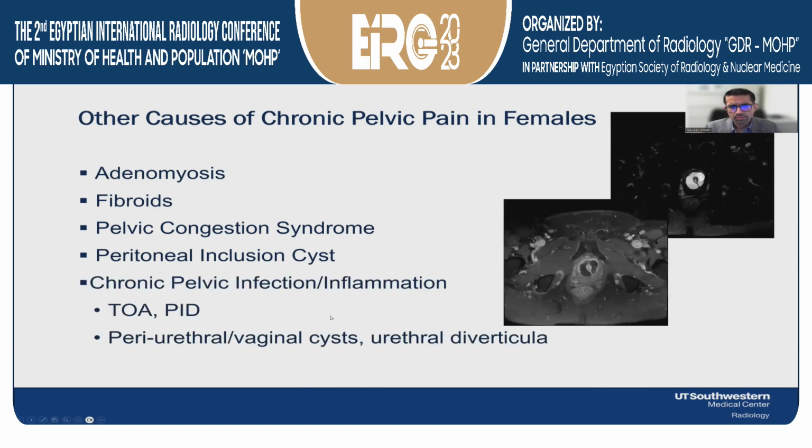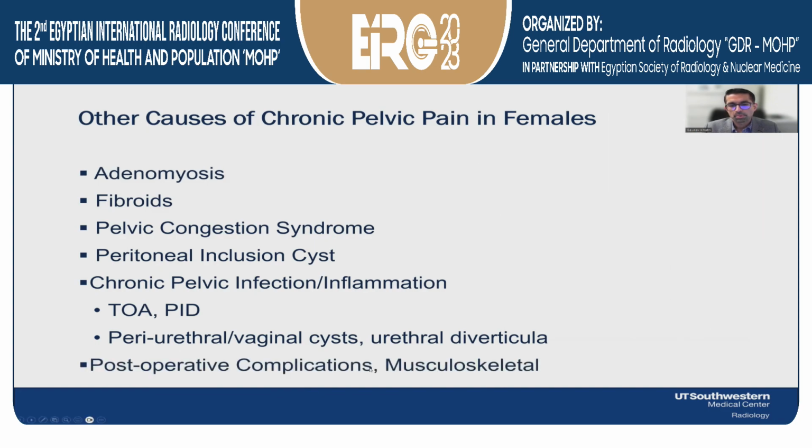And then you could have a variety of reasons for chronic pelvic infection or inflammation. Here you see an infected or chronically inflamed urethral diverticulum. You could have postoperative complication or musculoskeletal pain.